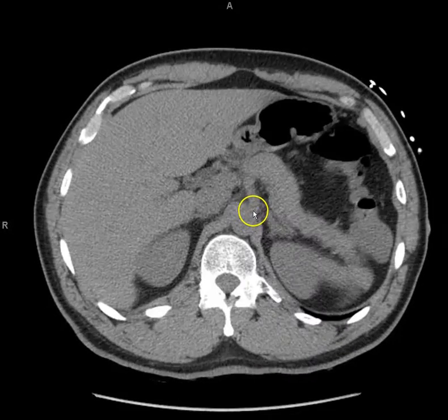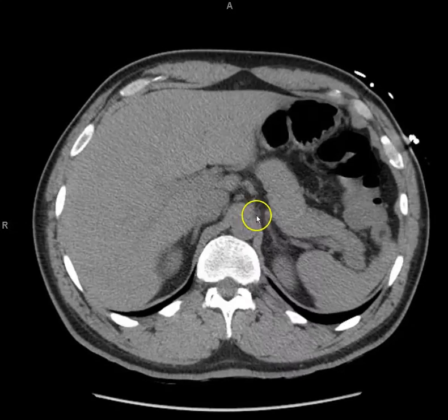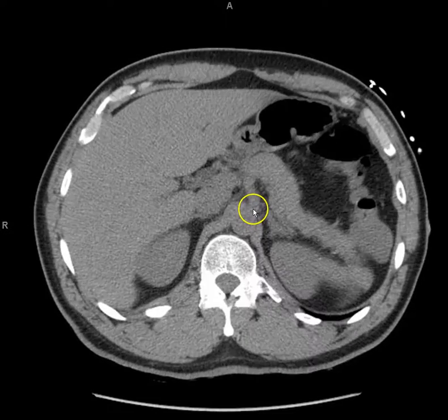And if you see, this is the first anterior branch off of the aorta as you get to the bone. As you're going down, this is the first anterior branch of the aorta. What vessel is this?